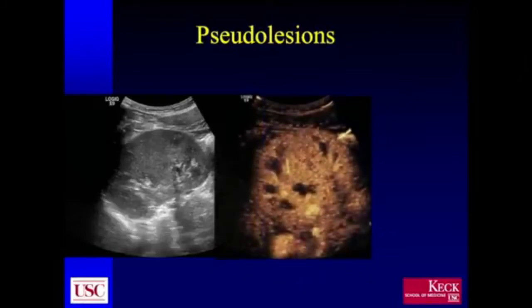and we were concerned that this could represent malignancy. You can see in the early or nephrographic phase that there is equal intensity of this area to the surrounding regions of the cortex, and that the timing, although you'd need real time for that, was similar.